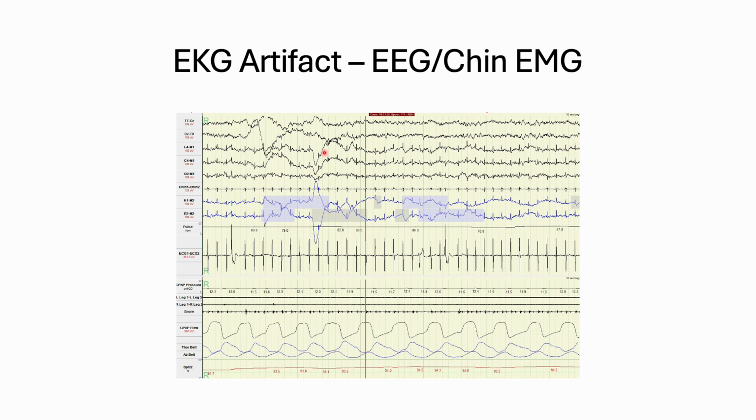But what I think this is, what else is happening when this wave happens? The eyes are clicking. This patient is in REM. The chin is way low. These are eye clicks, REM, and we've got low amplitude mixed frequency here. These are eye click artifacts. The patient is moving their eyes, and the EEG is picking that up. You will see that in REM, and you'll also see that when the patient is awake.